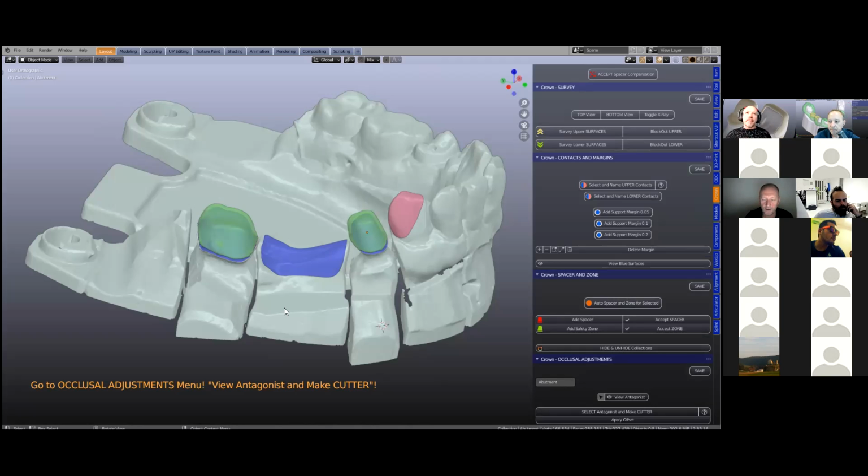I rolled it back to the previous theme that you suggest when you install Blender for the first time, but again, the colors have changed. They're not correct. For me, it's not a major problem because I know what the colors are and I know it's working fine because I'm used to it. But for new people, where do those colors come from? Are they automatically there with the model module when you install it from scratch?